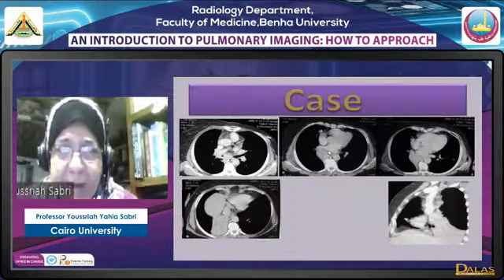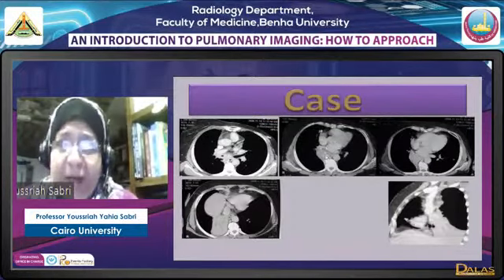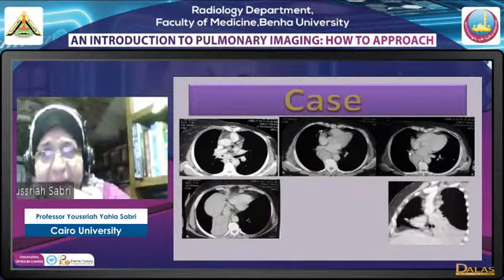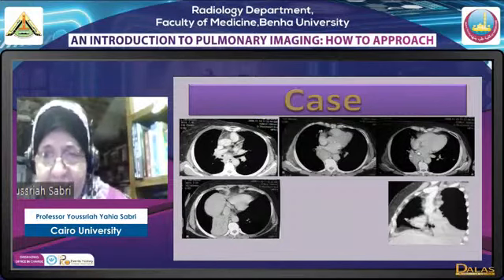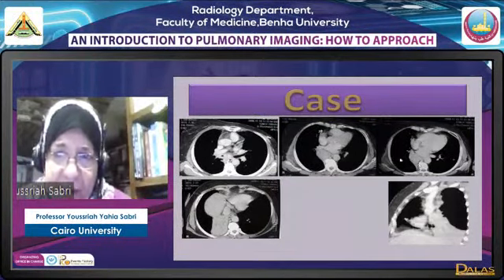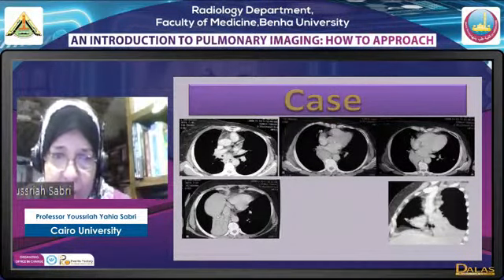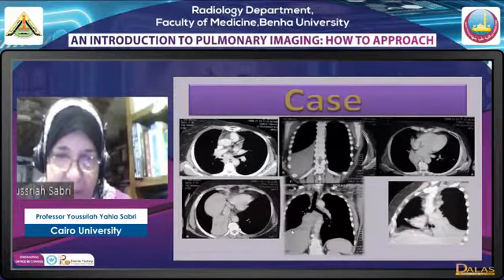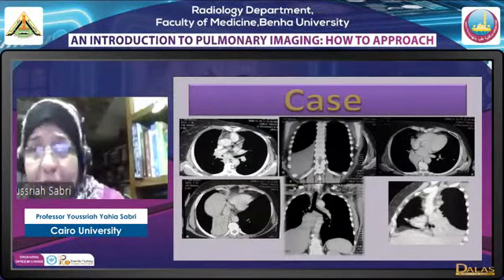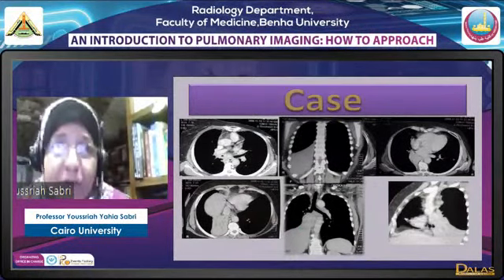Okay, are we only dealing with a mediastinal problem here, or is there another associated problem? If you go through it, you will find that this lesion in the posterior mediastinum is extending to join another lesion in the lung, and they're both amalgamated together, and they have a well-defined curvilinear margin. Having a well-defined curvilinear margin and then joining the lower lobe means we have a total lower lobe collapse. No aeration whatsoever. This collapse is due to obstruction, so it's an obstructive collapse.